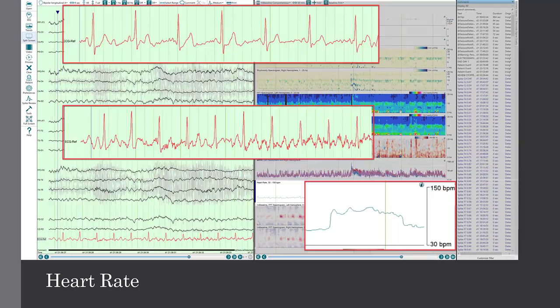And if we look at how the trend works out, here's an area of lower heart rate, an area of higher heart rate that we've highlighted, and we can see that change here. Now, in some cases, you may end up with an EEG where the seizures may not have a very distinct cerebral signal, but it has a significant signal in the heart rate trend. So anything that can help us increase that yield of recognized seizures, once we found something that's a good indicator for that, we can continue through the record, perhaps in a more efficient way, and increase that yield of recognized seizures.